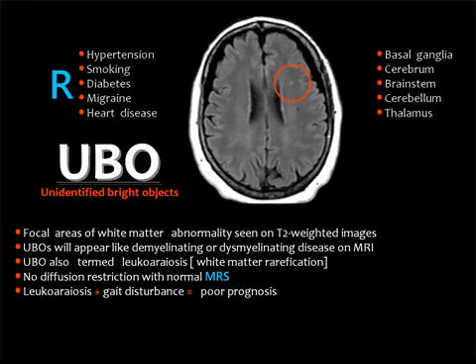Let us say he or she has some headache or other minor symptoms. Then the report will say that there is a bright focus in the white matter, no edema, no mass effect. Then at the conclusion, they say that this may be ischemic or maybe a demyelinating focus, for neurophysiologic studies.